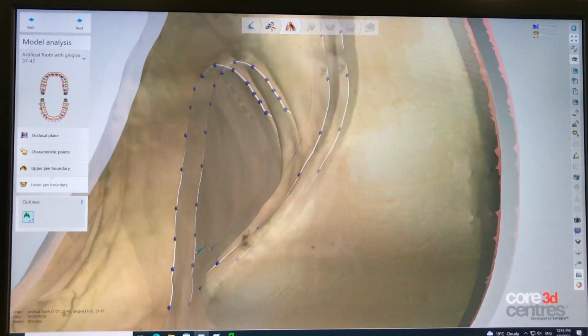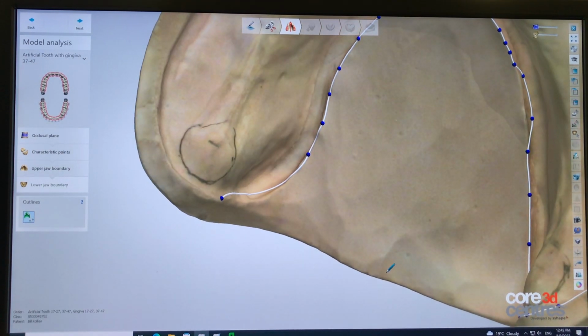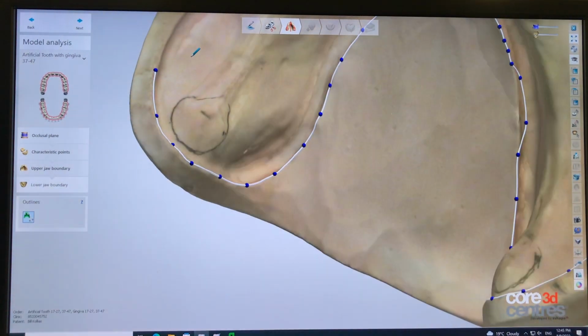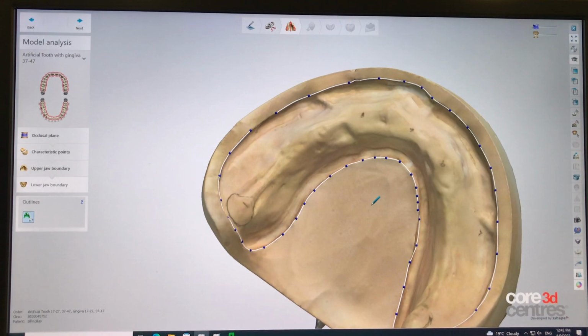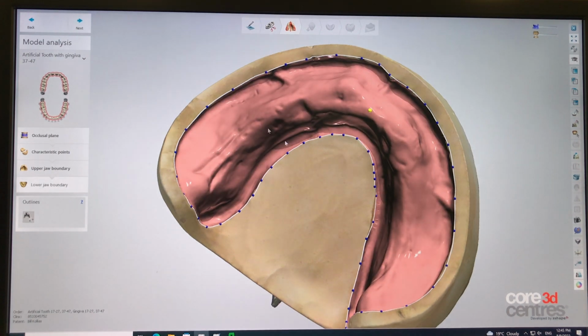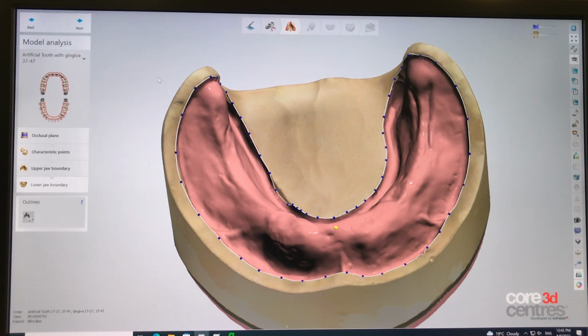I don't think that you want to do this. It tried to, but it didn't work out. So I'm going to right click, undo. So those 2 points were too far apart. And as I get near the end, I'm just going to zoom out this time, and you can see how everything is going to come together just like that. So that looks great too. So I'm just going to hit next.